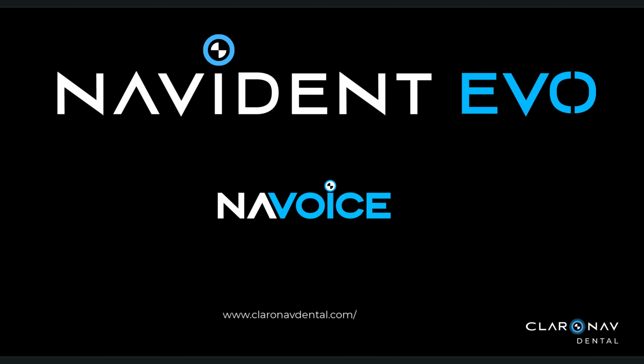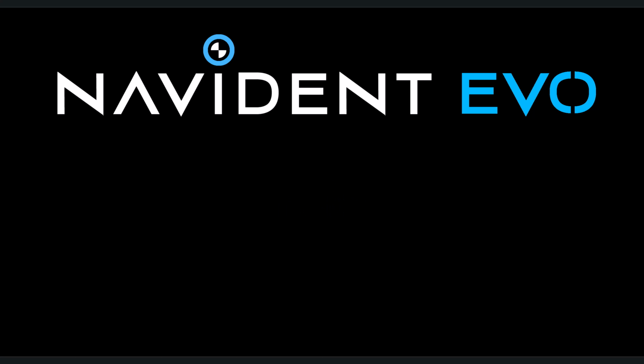That's Nav-Voice, an efficient hands-free solution for real-time implant planning. For more tips or support, visit our website or reach out to our team.